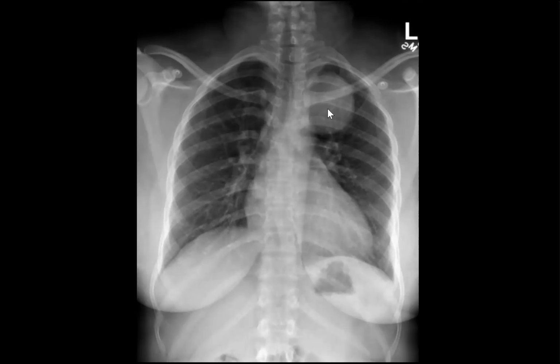Another point here, we add in posterior mediastinal masses no splaying of the underlying ribs. No bony lesions, no abnormal trabeculae, no pulmonary lesions, and symmetric breast shadow. Differential diagnosis, as you said, but common is common. Neurogenic tumor first, followed by esophageal duplication cyst. Normal vertebral height, unlikely to present abscess or hematoma with absence of history of trauma.